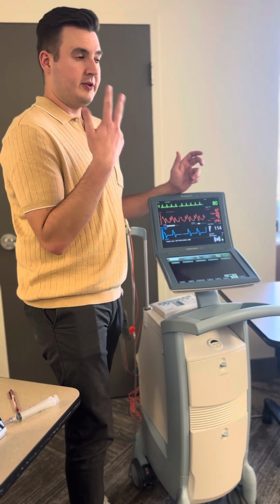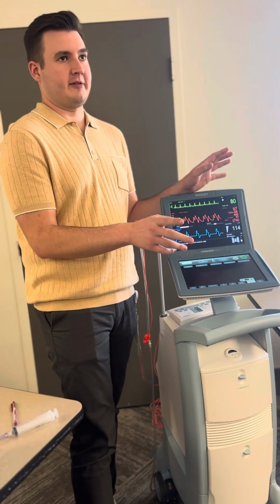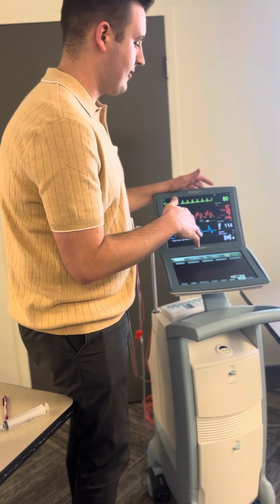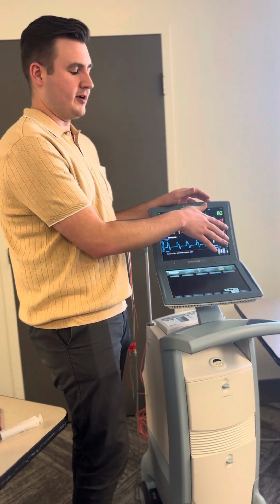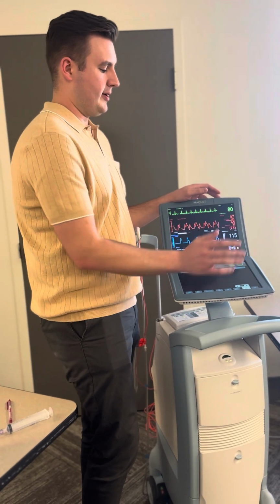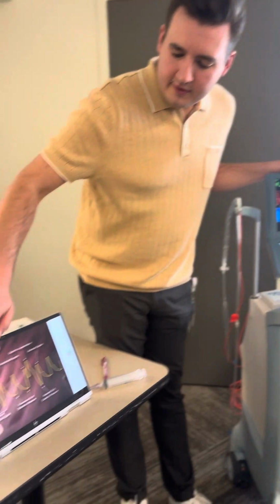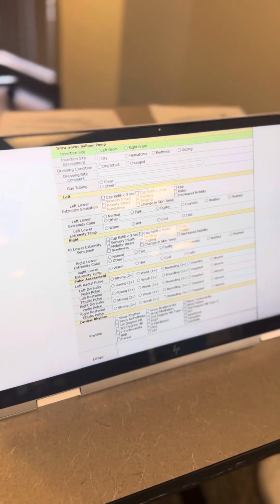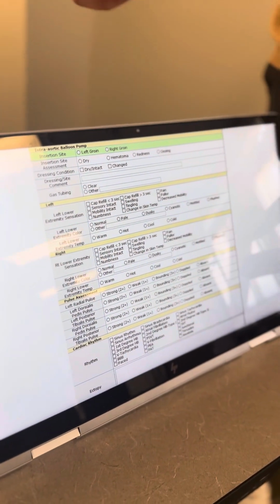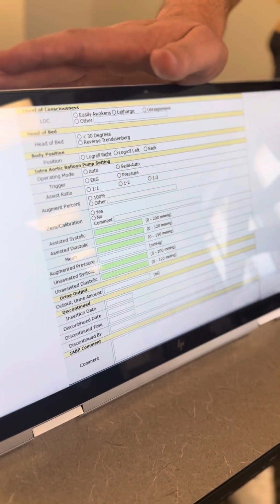So every 2 hours, this patient is a 1-to-1, by the way, so it's the nurse's only patient, so there's a lot you have to deal with. But every 2 hours, you're going to have to chart all these unassisted and assisted pressures. You check your augmentation every hour. This is just a basic cath lab patient. You're just looking for signs of ischemia in their extremities, you're checking their pulses, all that stuff. But really the important stuff is going to be here.